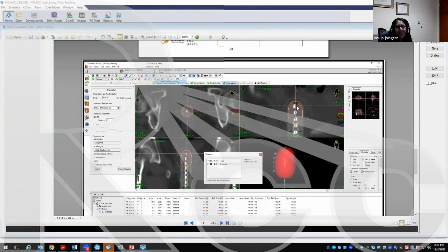Okay, so can y'all see that? This is a dome, right? So it's conical. The top part is a dome, and then you've got the 2 cylinders. But this is all we treat of the vagina. 3 cm, right? We only treat 3 cm. ABS is between 3 to 5. I always only treat 3. And I have actually had no recurrences. We've published our data, and we're going to publish updated data on that.